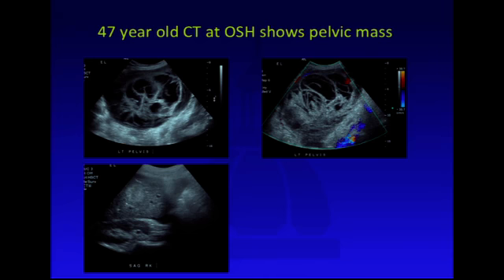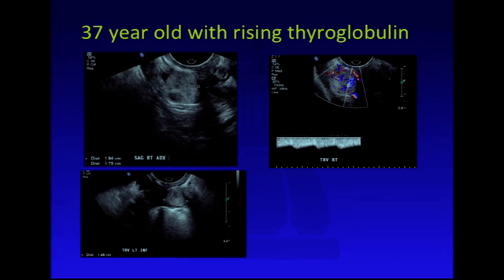This is a patient who had known colon cancer, and we can see bilateral involvement. I'm just showing you the left, but she had very large, multicystic, multiseptated masses in the pelvis. I'm showing the left ovary here, and she also had an echogenic mass in the liver. This is a patient who had mucinous colon cancer with metastasis to the ovaries as well as the liver.